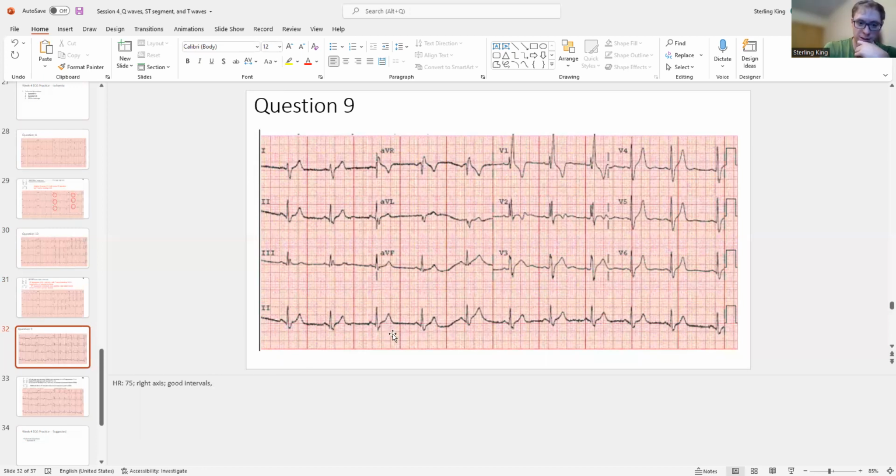Rhythm: there's always a P before the QRS, and it doesn't look elongated. There are no dropped QRSs, so normal sinus rhythm, since the sinus node's controlling it. Looking at hypertrophy, for the atria, it doesn't look like it. For the ventricles, doesn't look like it. Looks like a right bundle branch block here. So we could query right ventricular hypertrophy, and then we have right bundle branch block. Say barbecue, BB, and the QRS.